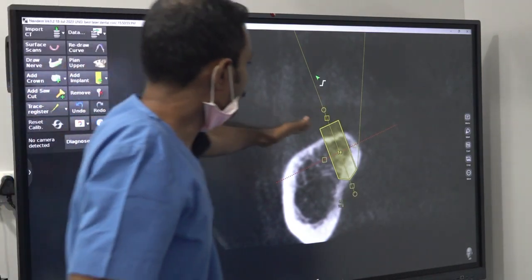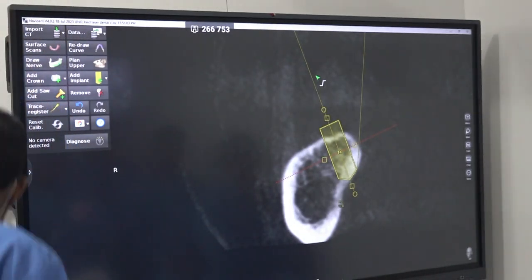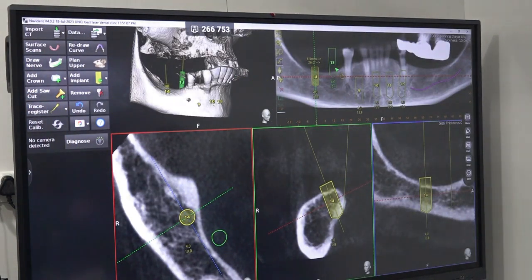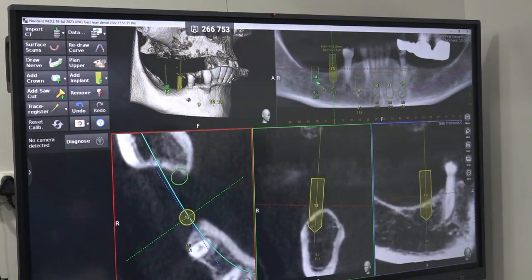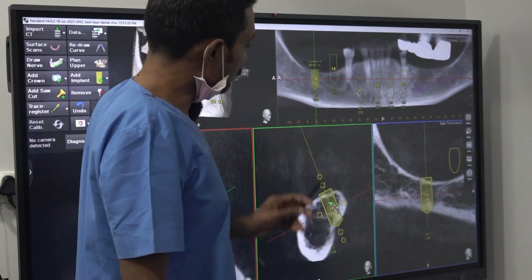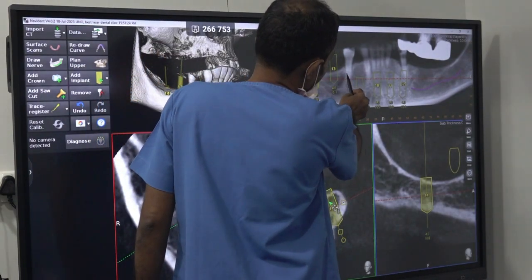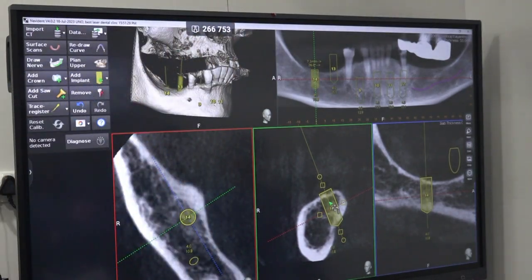You have to include the soft tissue also. So our final plan is placing the implant much distally by doing a lingual cortical engagement. And there is one more option that we can see, just distal to the 5. Sometimes bone is available, we will see.